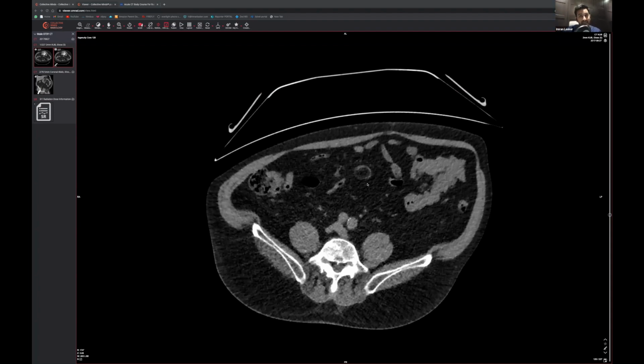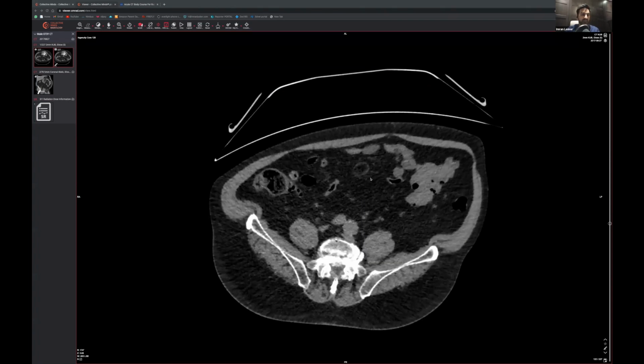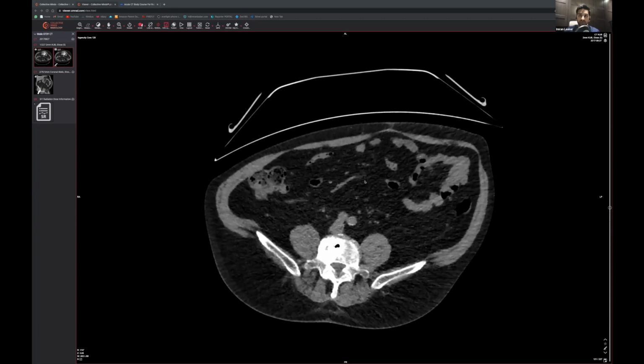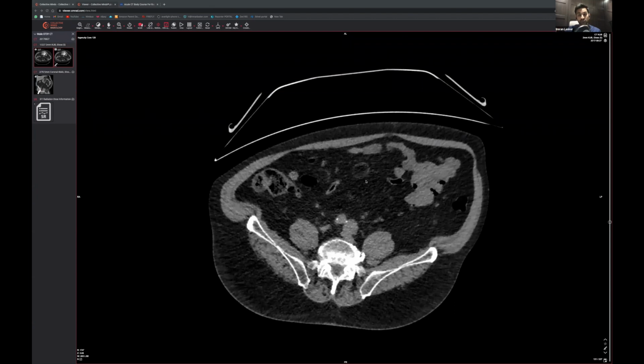So if it's on the anti-mesenteric side and you've got this spherical hyperdense lesion with a more radiolucent center, this is more likely to be in keeping with, exactly right, epiploic appendicitis. Slightly unusual place to have it, only because the sigmoid colon can be so mobile. But if that was anywhere else in the place that you'd normally expect the sigmoid colon to be, you would say that that is epiploic appendicitis.